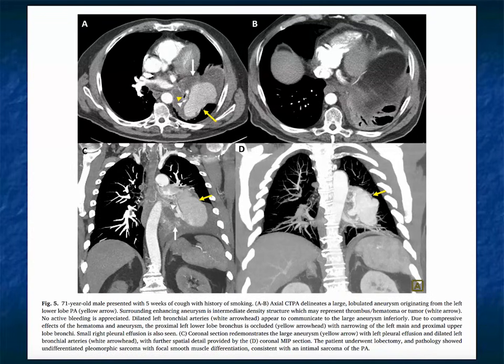Here's a patient with a larger pseudoaneurysm, and this patient typically would present with coughing or hemoptysis. These are the ones you really worry about, because just looking at this whole process, it looks like there's a big pseudoaneurysm present, and there probably was some bleeding. Again, this is probably not one that can be embolized. This is one where surgery becomes very, very important.